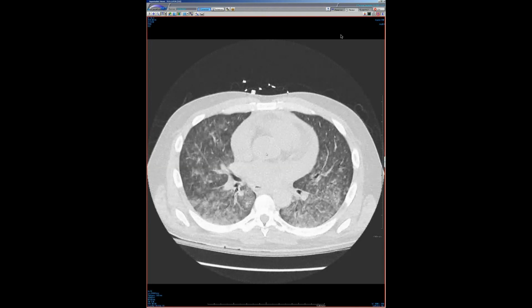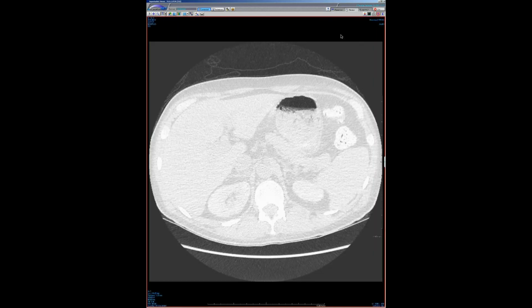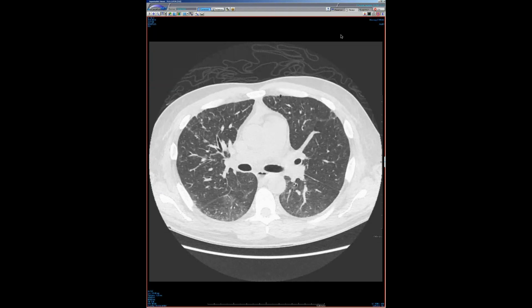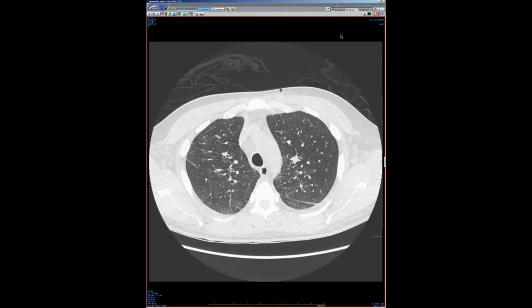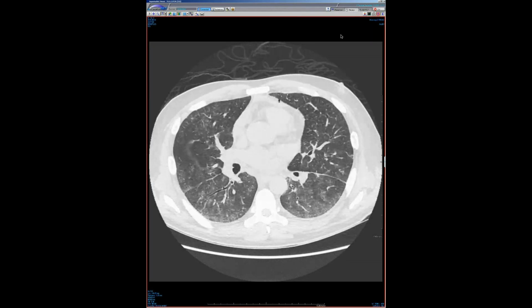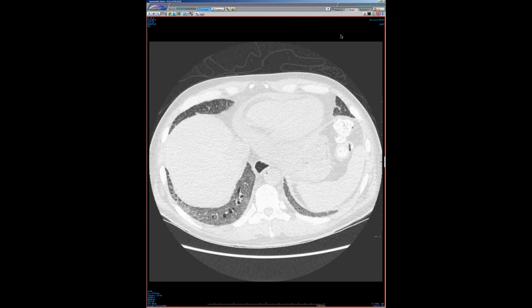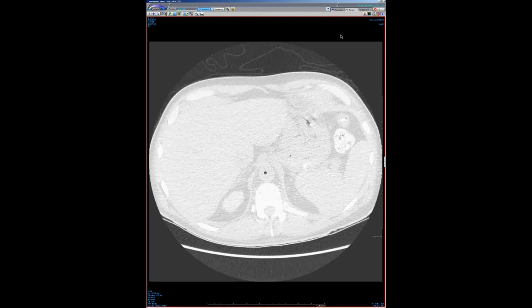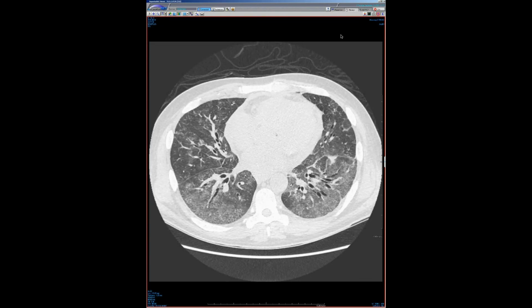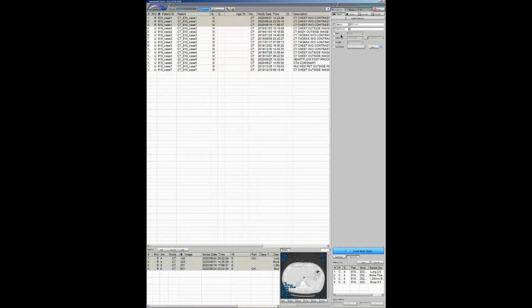And then a few days later, they treated him with steroids, the hemorrhage got better, but then he developed acute lupus glomerulonephritis in-house, and then has the kind of pulmonary edema from the lupus injury. And they called him scleroderma. I wouldn't call the esophagus really scleroderma at this point, but it has a little esophageal dilation. So just within like 2 weeks, numerous manifestations of lupus and mixed connective tissue disease.